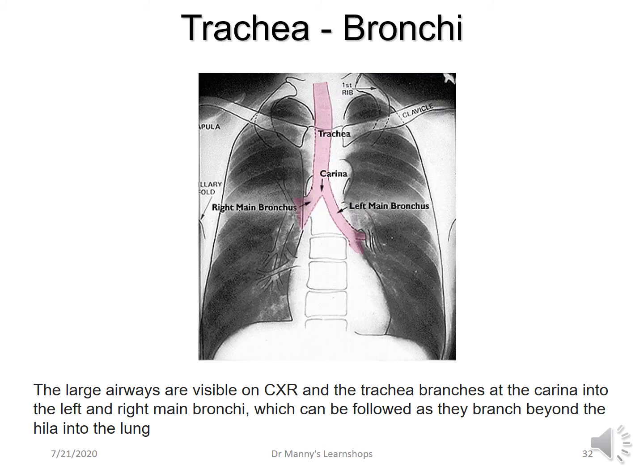The hilar are the areas of blood vessels that are related to the right and left pulmonary artery, which on this image is typically located around the right main bronchus and the left main bronchus. The carina is just the bifurcation. You have the right main bronchus and the left main bronchus. They're the bifurcations.